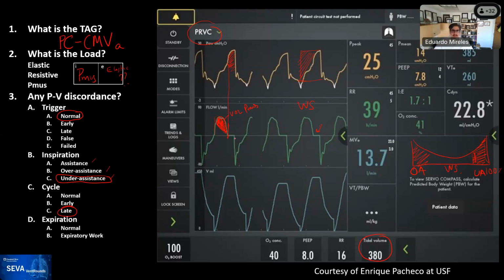Yes, but I was referring to the part where we can see the work shifting should be from the beginning of the trigger up to that part you draw. Yes, that's what I'm trying to see.